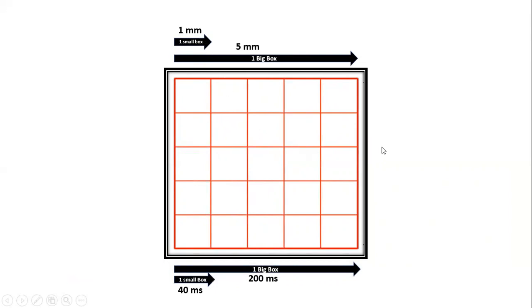All right. Now, looking at our height or amplitude or size going up, remember we're measuring the amplitude of the waves now. So we use millivolts. One big box equals 0.5 millivolts. And we know that this big box is made up of smaller boxes inside, and there are 5 of them, which means each smaller box going up equals 0.1 millivolts.